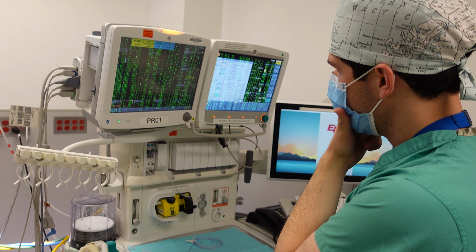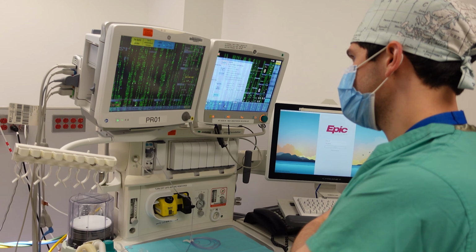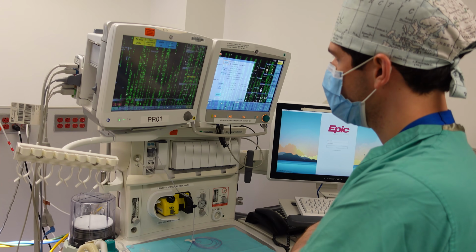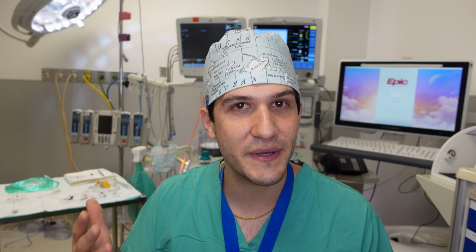But in reality, what's going through the anesthesiologist's mind is they are trying to assimilate all of the data that is continuously coming at them while also trying to take care of the patient, draw up medications, administer medications, understand what's going on in the surgical field, be able to respond to any sort of changes. For example, if there's a major bleed that happens unexpectedly and they need to be able to respond to that while also paying attention to what's going on with the patient's vital signs.